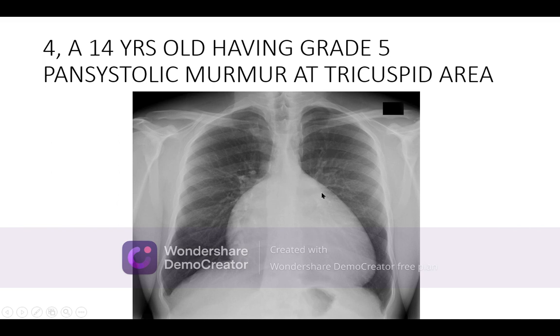Only bronchovascular markings are visible bilaterally, touching the lateral one-third. Many congestive changes are seen in the lung. On the lower part, there is hypertransparency or compensatory emphysema. This angle is slightly obstructed here, the costophrenic angle on the right side. The cardiophrenic angle is normal on this side. Very clear costophrenic angle on the left side.